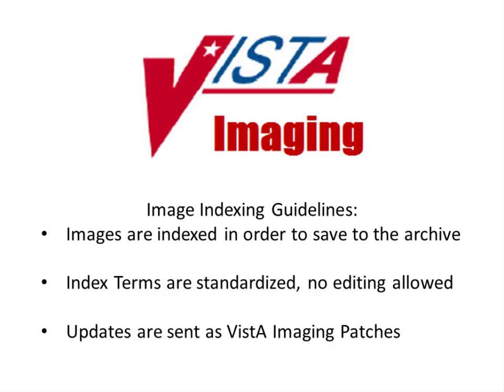All image captures are indexed in order to save the image to the archive. The index term files are standardized for all Vista imaging systems, and they are not to be edited by the sites. Updated index terms are distributed as Vista imaging software patches. Requests for additional index terms or modifications to existing terms are to be submitted on the Vista Imaging SharePoint site. IHS sites should submit requests for index terms by contacting the VA's Customer Support Help Desk.